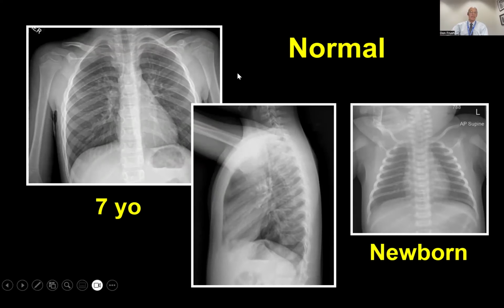Now, it's not my intent to go through the various mediastinal landmarks here. For example, this is the azygoesophageal recess, this little edge right here. These are things that radiologists look at in terms of pathology, but it's important for you as we go through the following films to at least get an idea of what the range of normal chest x-rays look like here.